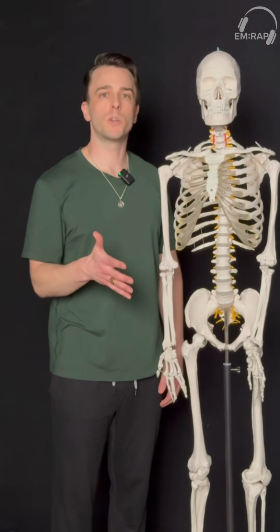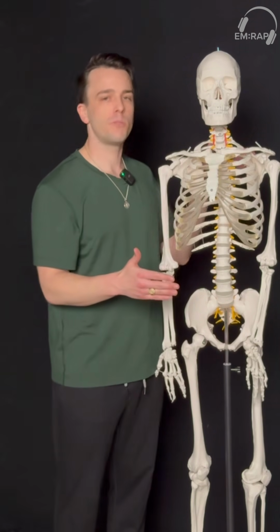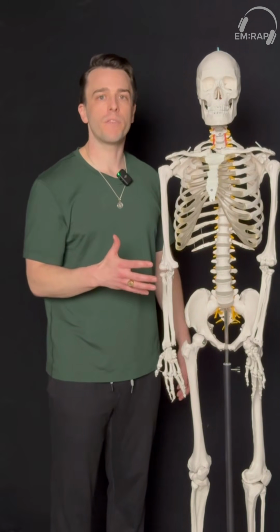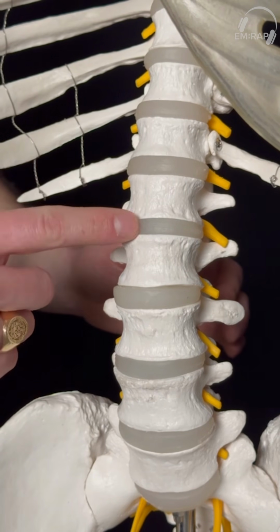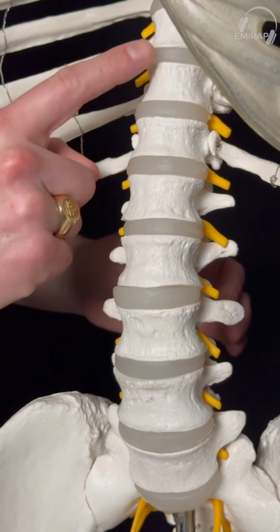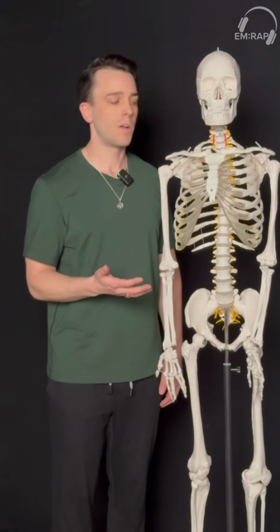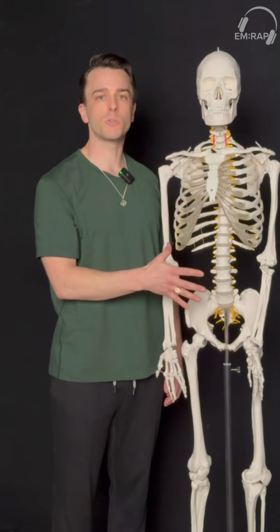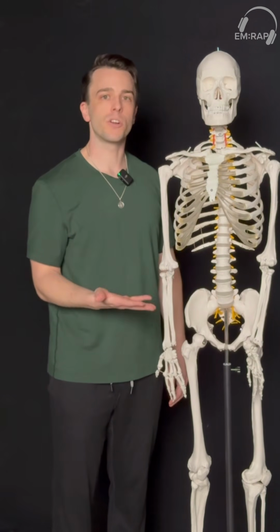And what we mean by exposure is how much radiation you are sending from your X-ray source to the backboard. And we know a film has adequate exposure when you can see the thoracic spine disc spaces clearly on your PA or AP chest x-ray. You have an overexposed film when the patient is getting too much radiation. So the film is going to be black. You're not going to really be able to discern anything.